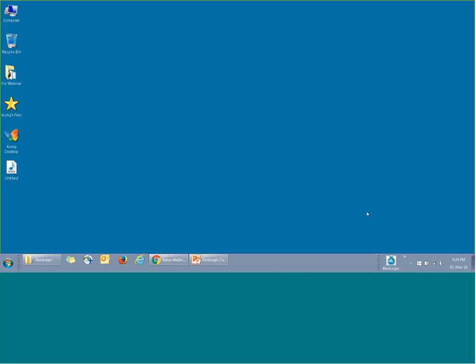Okay. Let me just hold on for a while. So far, is everyone okay? You can always put in the chat if you want to. Okay, just hold on for a while. I'm restarting my RemLogic.